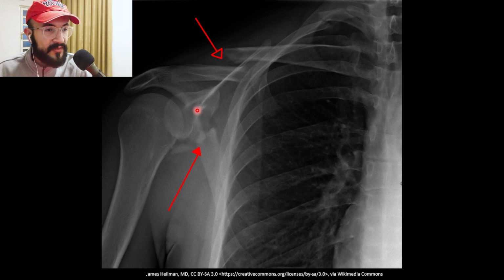And then we move on to the glenoid. We can see that the glenoid is normal, but when we move on to the glenoid neck, we find that we have a fracture here and we have a displaced fragment here. Then we check the scapular spine and the acromion, both are normal, and we check the rest of the scapula looking for any fractures, and it's all normal.